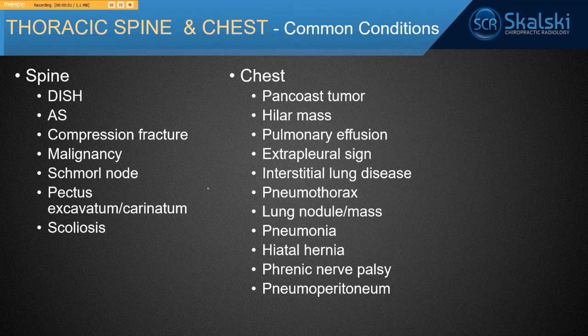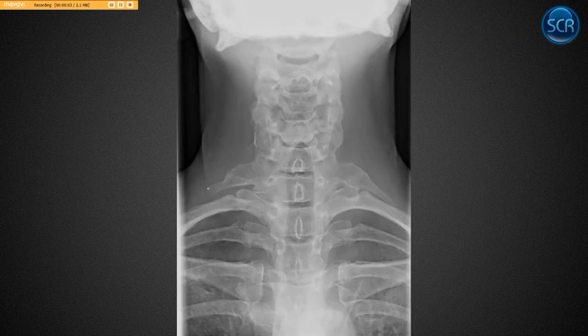All right, so this is on the thoracic spine. I just realized in the end of the cervical one, I forgot to include a few cases of cervical ribs, so I just want to show you those. And how do you know they're cervical ribs? Well, first of all, they're these tiny little ribs, but the other thing is sometimes they're more well-formed. T1's transverse processes should point up like this, and C7 should point horizontal to down, and these are coming off of that. So that's cervical ribs.